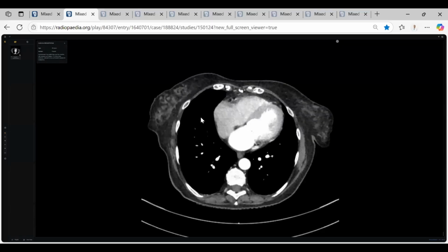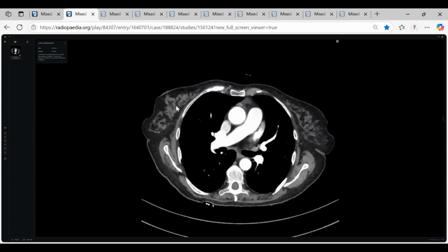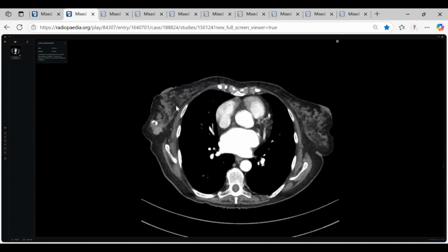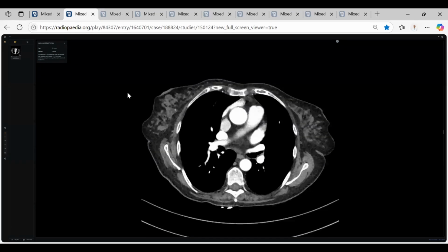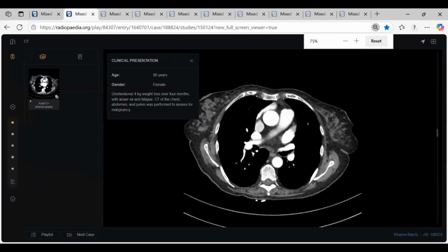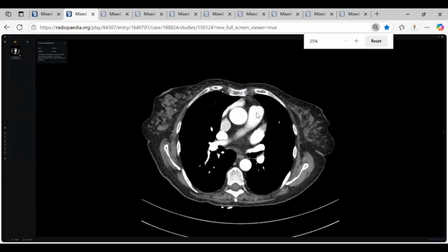Very critical, especially I stress in the history, a 60-year-old female patient. The mammogram is typical and the ultrasound is so typical. See how to differentiate very dense: the mass is very dense in comparison with the rest of the breast tissue. And by the way, this breast tissue is too much in comparison to an 80-year-old. Really, it's too much. I don't know why.